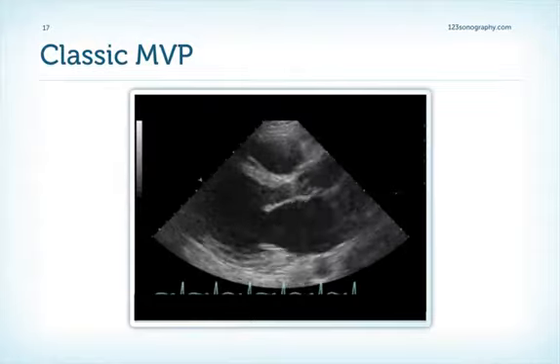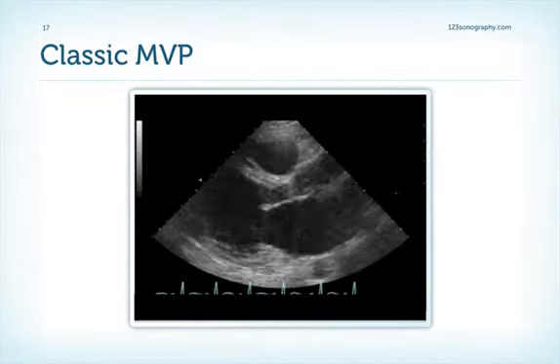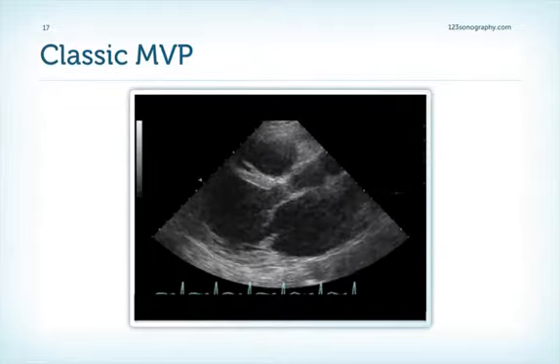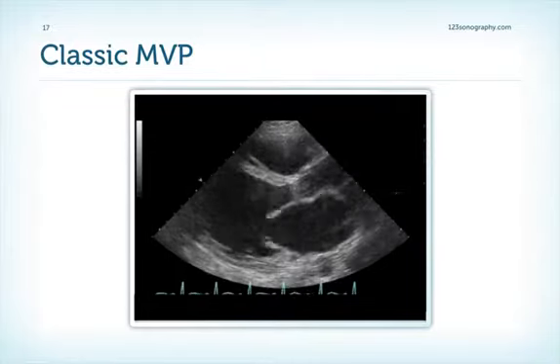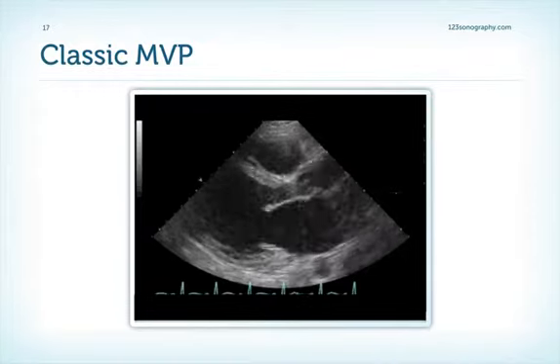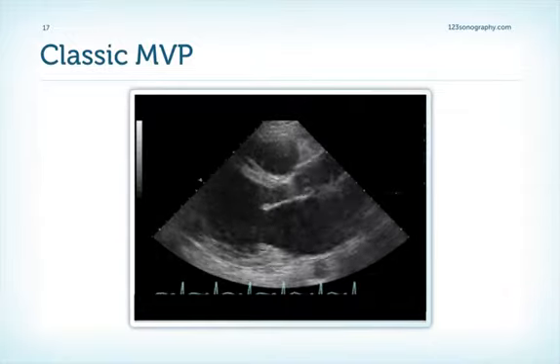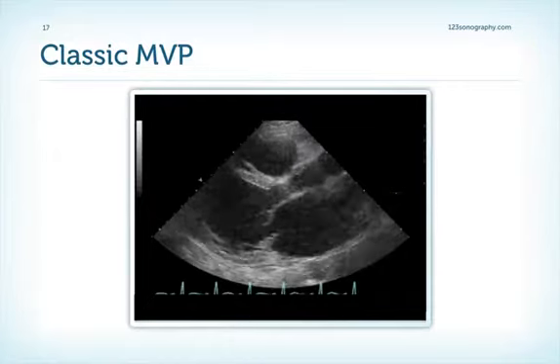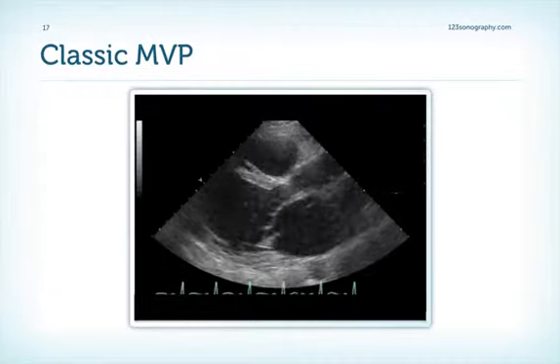One thing I almost forgot to mention with respect to the mitral valve. It is very difficult to make the diagnosis of endocarditis in the setting of a myxomatous mitral valve. I think I mentioned that already in the chapter on the mitral valve. Here we have a special situation. First, myxomatous mitral valves are thick. Therefore, they can look very similar to vegetations. Second, patients who have myxomatous valves have a higher likelihood of developing endocarditis in the first place. So there's a higher predisposition.